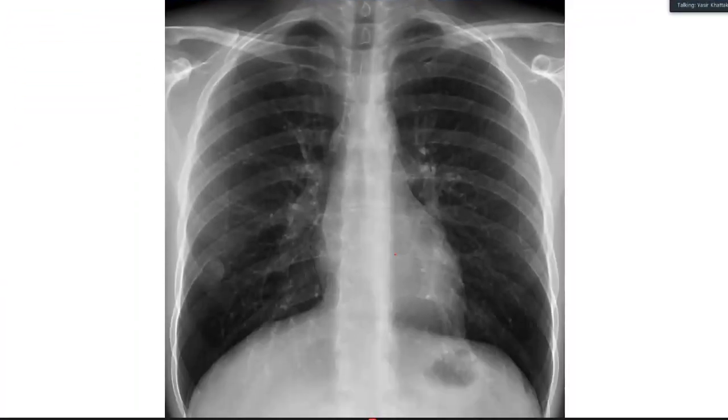This is the X-ray frontal projection of the skeletally immature or mature patient, in which I can see that there are some calcified nodules apparently present in bilateral lung regions. Also, along the right lung middle zone, a well-rounded opacity is seen.